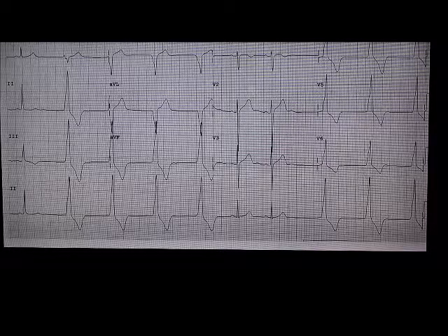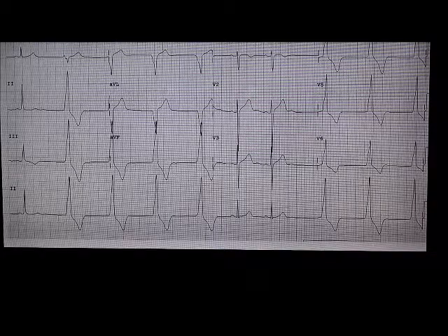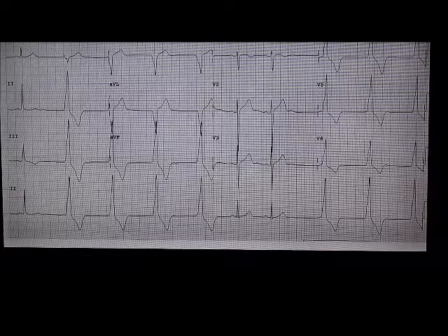Yeah, yes, and is there dissociation here? Because here a P wave starts and then the QRS comes, so this is not a normal conduction. This wave does not conduct to this one, so it's not. But this is not tachycardia, but it's a rhythm fusion, exactly. So what do you call this?